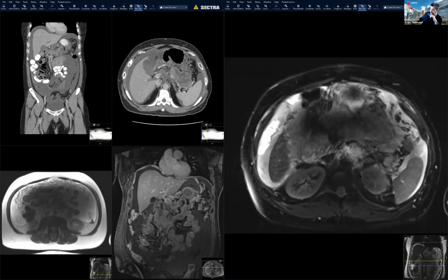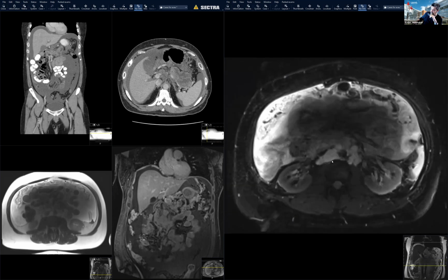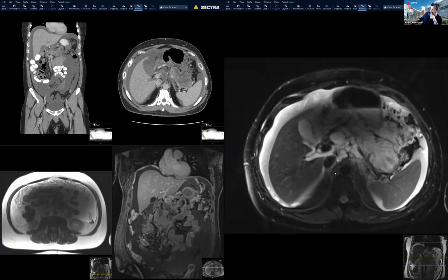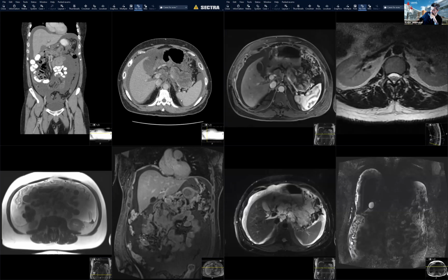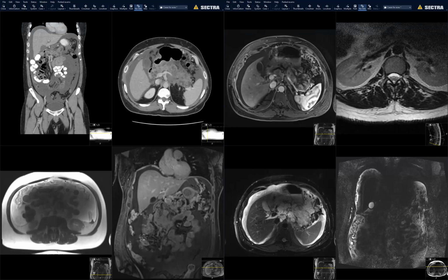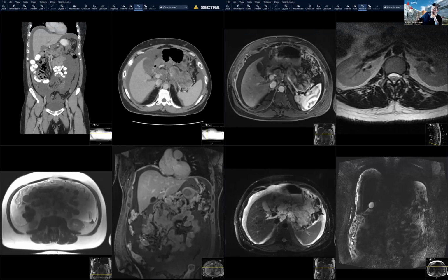That was Gitanjali's thought, is it because it's a mucinous tumor? Is that why the nodules are bright too? But we were not really sure why that happened. And yeah, there's also a colloid cancer that you can develop in IPMNs, and sometimes those can be very T2. Right.